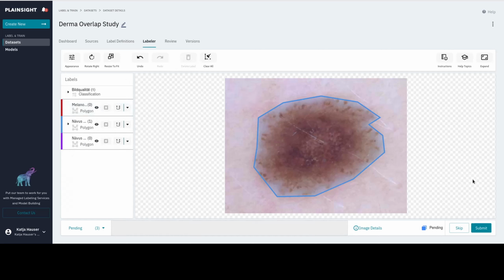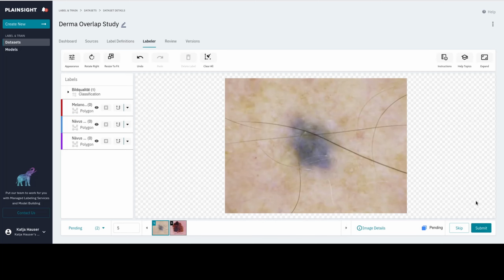If you're now satisfied with your annotations and your explanations, please click Submit. Depending on how fast your internet connection is, it may take a moment for the next image to load. I'd like to ask you in this case not to click Submit twice, simply because you'd then send the next image without any annotation and without diagnosis.